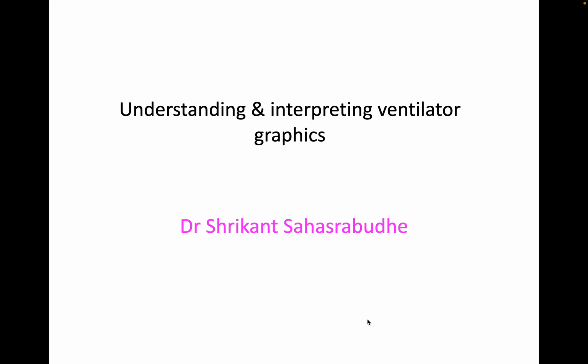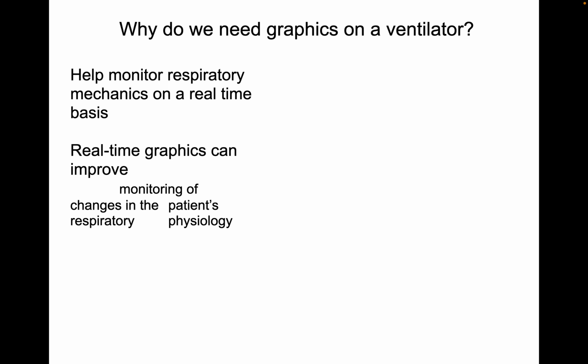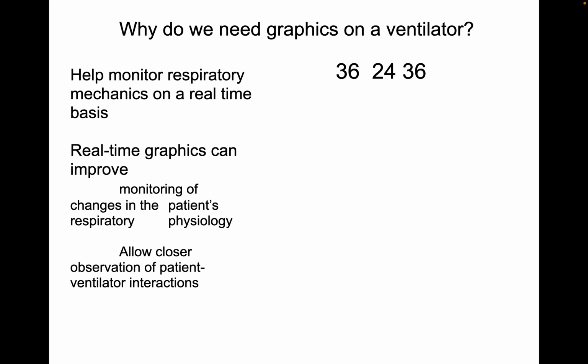So at the outset, I would like to tell why we need the graphics on the ventilator. It will help monitor the respiratory mechanics on a real-time basis. The real-time graphics can monitor the changes in the patient's respiratory physiology and also allow closer observation of patient-ventilator interactions.